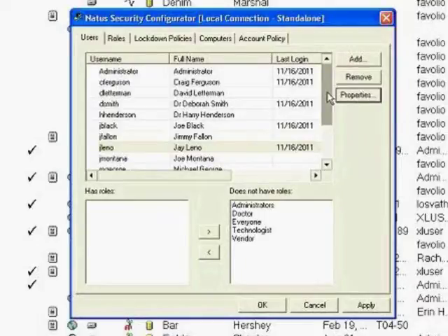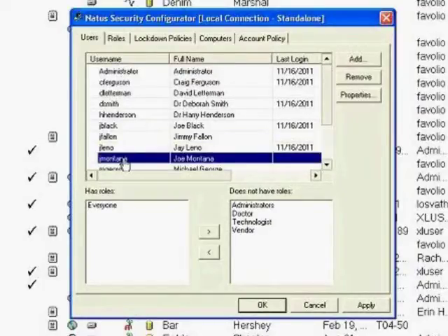When you think about creating permissions for users, you may think about it in possibly one of two ways. One way, if we were just thinking logically, is I could select a user, take Joe Montana, and look for some type of configuration screen that says: let's allow Joe to have access to the review window, let's give Joe access to making changes to a system setting, let's give Joe access to recording a study.